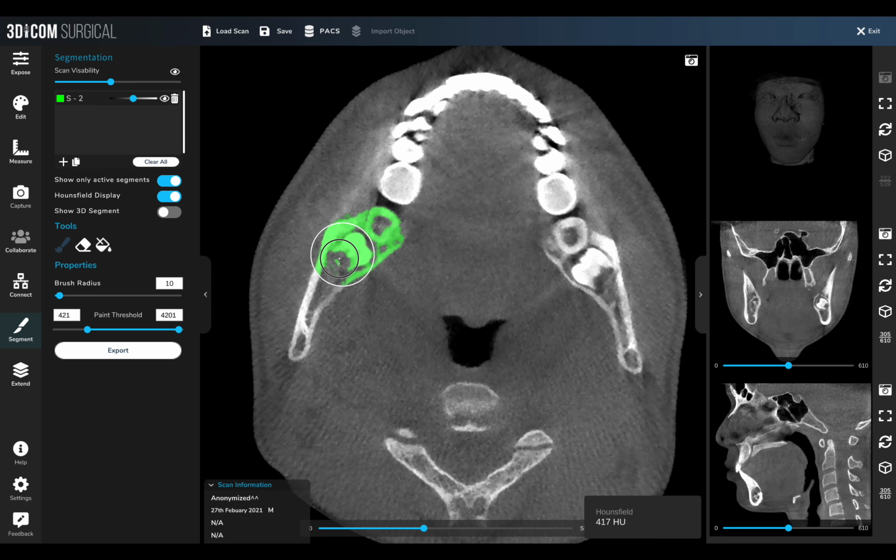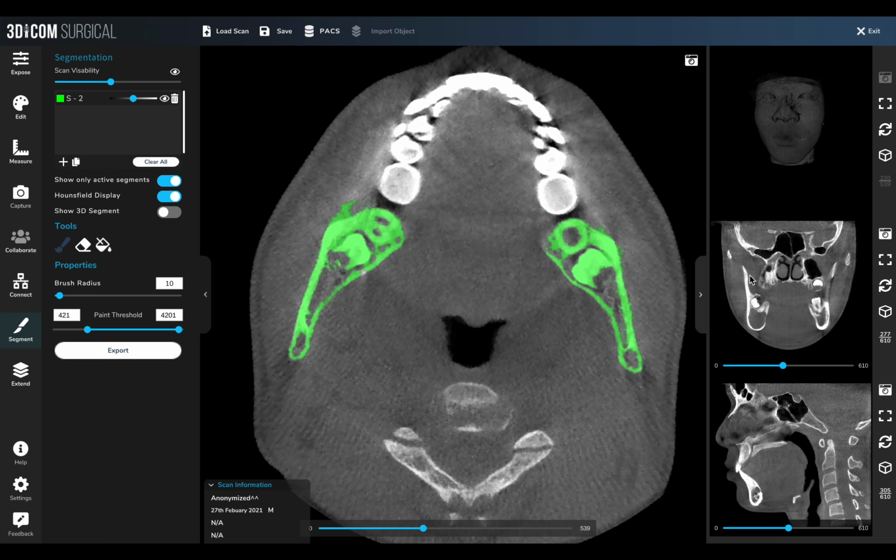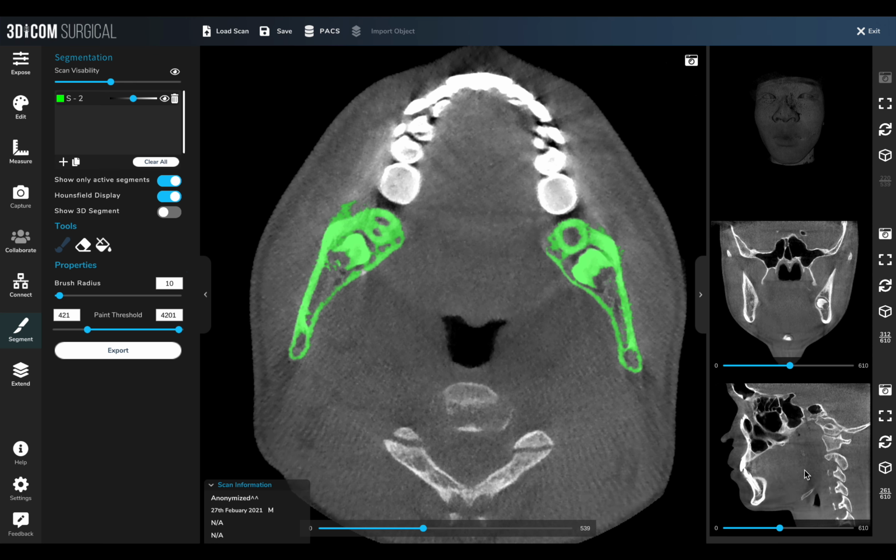also it's really making my computer hot at the moment, but it's not too laggy. If we go through and make these drawings here, it's not showing up in the 2D views. So you can see how laggy these side views are, but it's not showing the segmentation in the other 2D views.